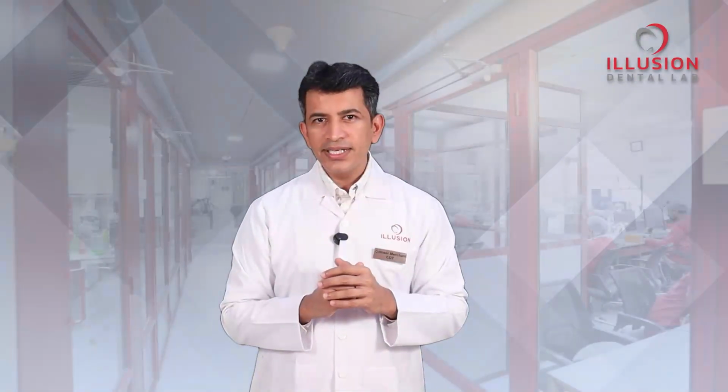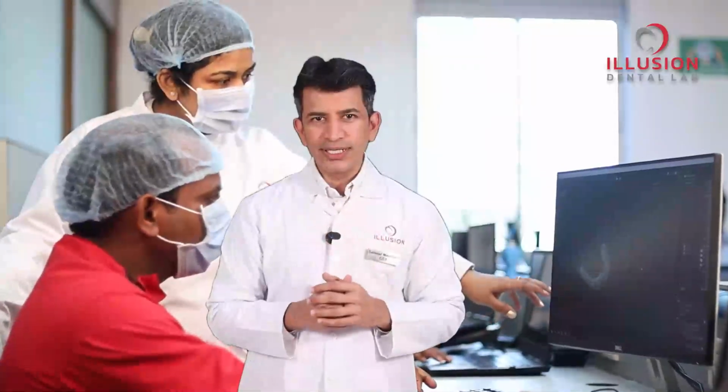So how does iBAR make this possible? The secret lies in the way iBAR and its prosthesis are made in the lab. Let me take you behind the scenes and show you why Illusion's iBAR truly stands out. At Illusion Dental Lab, every step is performed under the direct supervision of an expert prosthodontist, and it all begins with collecting accurate patient data.